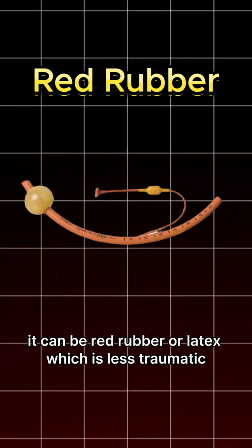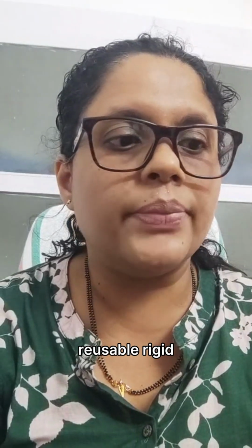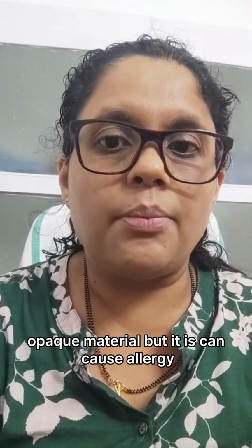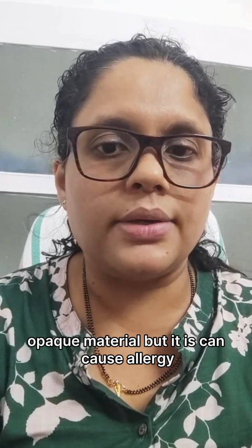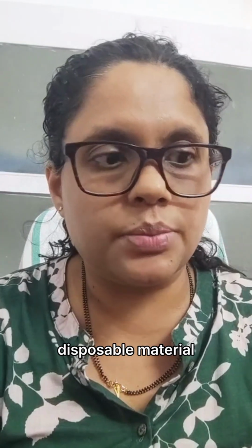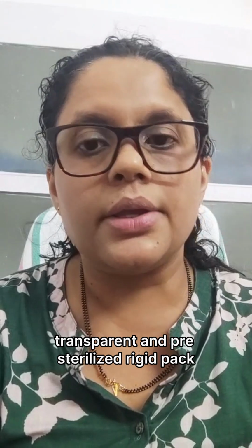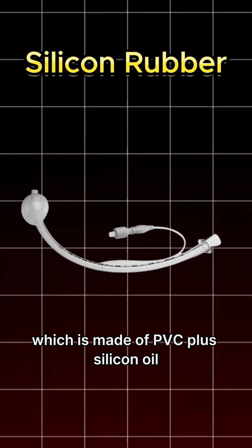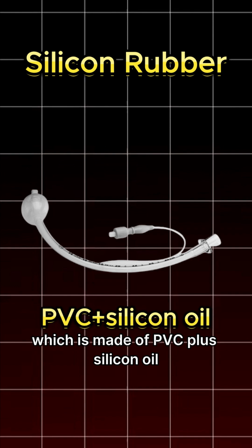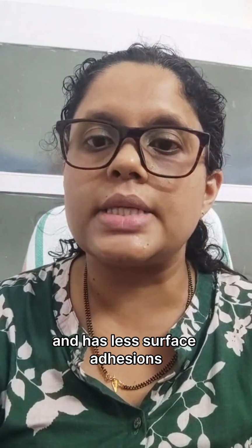Material of the tube: it can be red rubber or latex, which is less traumatic, reusable, rigid, opaque material, but it can cause allergy. Second is polyvinyl chloride, which is a cheap, disposable material, transparent and pre-sterilized, a rigid pack, which is tissue compatible. Third is the silicone rubber, which is made of PVC plus silicone oil. It is opaque, cheap, reusable after autoclaving, and has less surface adhesions.